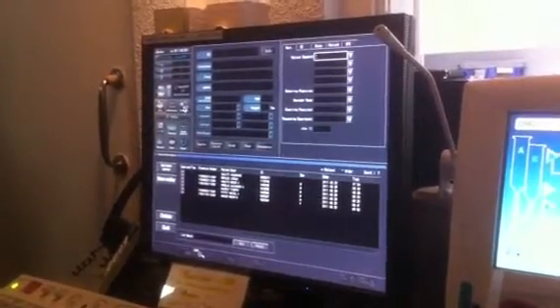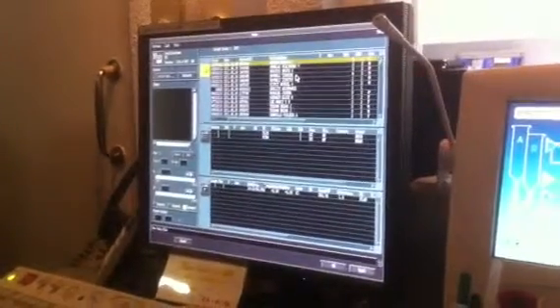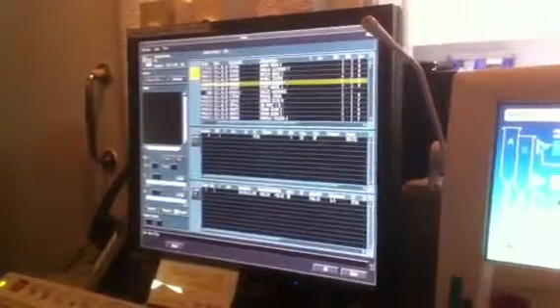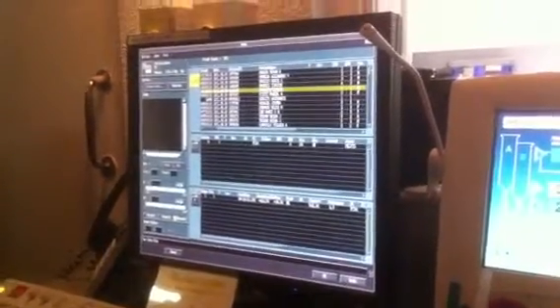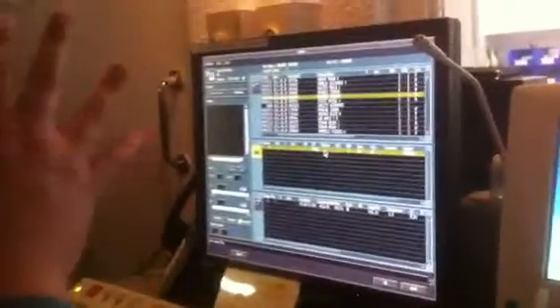Now if I go into raw data, there are now two Timothy Haverleys. See that? Now that I've got it split off, I can do anything I want. Okay, so that's how you split the raw data. That's like stage 1. You guys understand that?